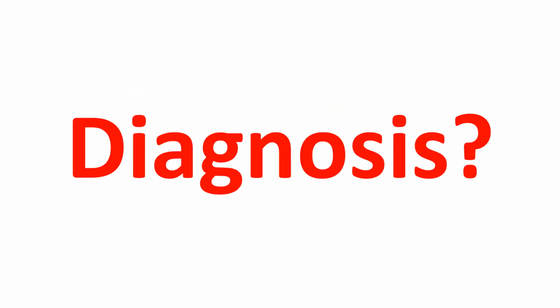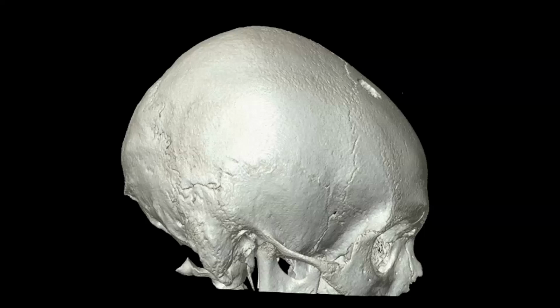Hey, let's do a CT warm-up. Anyone up for a CT warm-up? Okay, I want a diagnosis. I'm going to wait for the chat. A diagnosis does not have to be precise to the molecular signature all the way. It's just, what can you say confidently from the information that you know? What is the most likely explanation for what you're seeing? All right, here we go. What's the diagnosis? Let's see if we get someone to render a diagnosis on this. Nice CT.